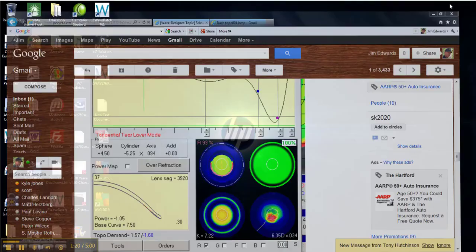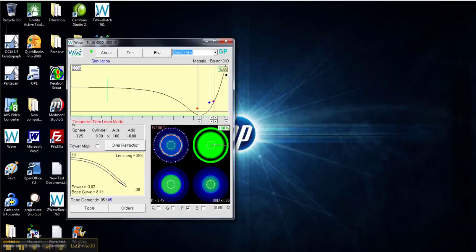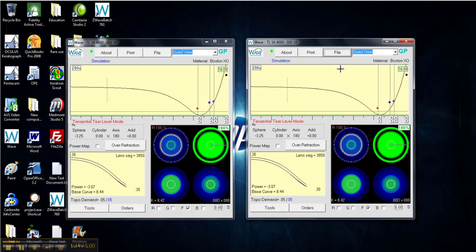So let's bring up a typical corneal scleral design, the same type of thing. And the way you would do this is basically by manipulating these three control points. Basically, the first thing you want to do is to lift the blue control point. So I'll begin doing that. I'm going to put this on a more sensitive scale so it can go a little bit faster. And I'm going to raise this blue point until this line is almost level.